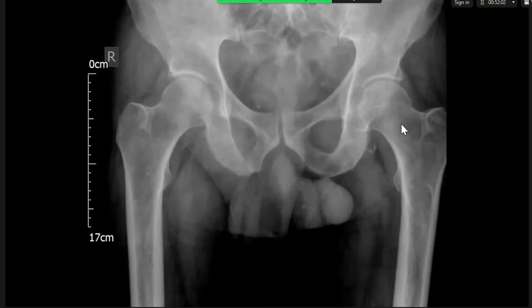Okay, so I've got an AP pelvis of a 73-year-old male patient with right hip pain. The hip joint is in normal alignment. There are no focal lesions of the upper femora. Looking closely, the acetabulum is intact, as are the pubic rami. There's an impression of lucency over the left pubic rami, but I think that's just projectional. But there is definite asymmetry overlying the sacral ala, and I'm concerned that there's a lytic lesion. Okay, don't worry about it.